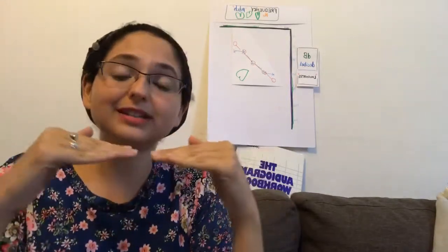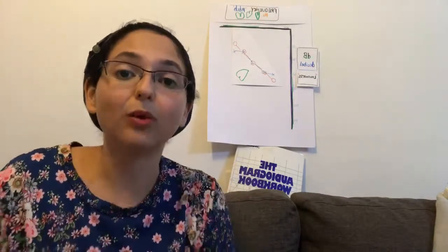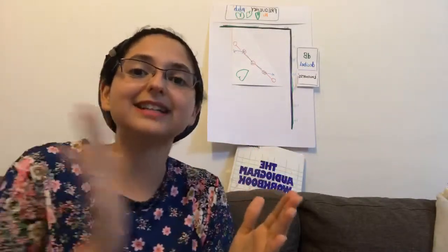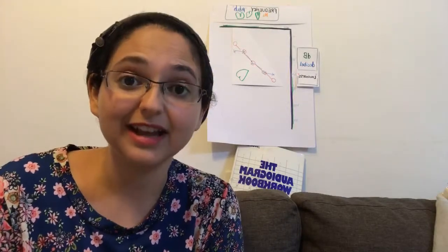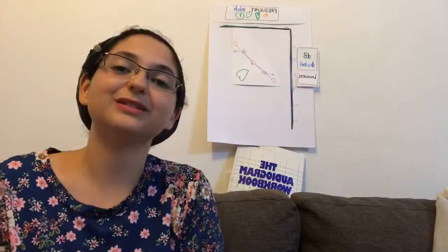So closer to the top is normal hearing. The lower down you go is more hearing loss, the degree of hearing loss, how much hearing loss. And from side to side, it tells you what kind of frequencies are affected. If it's to the left, that's the low frequencies. If it's to the right, then it's the higher frequencies.